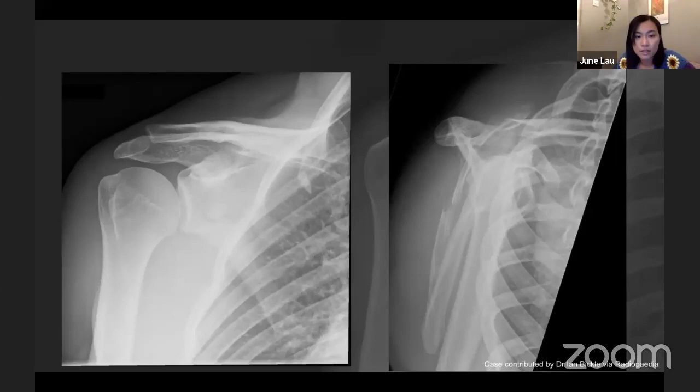This one, again, bones. And I'd be impressed if you get this, it means you've paid attention, basically.